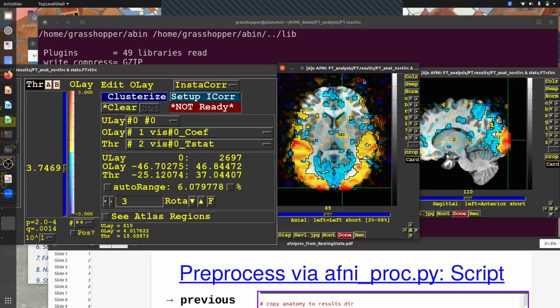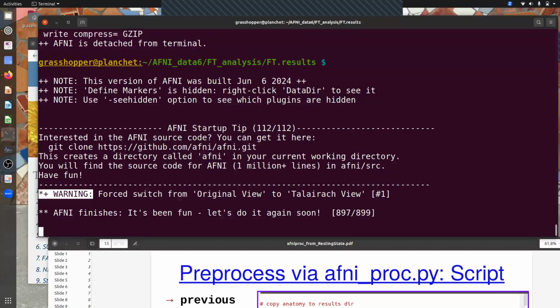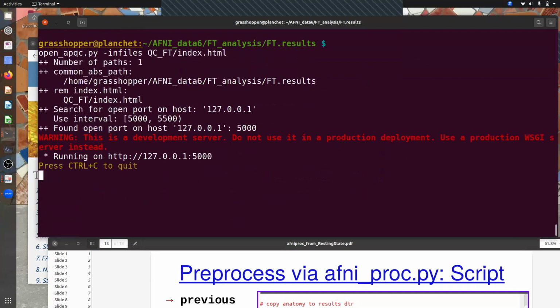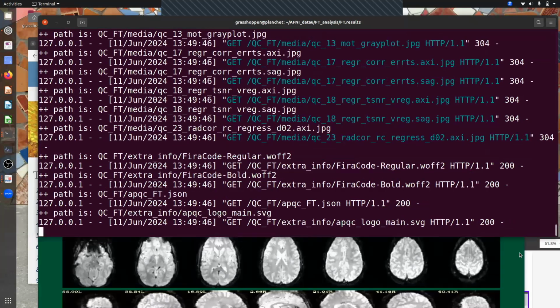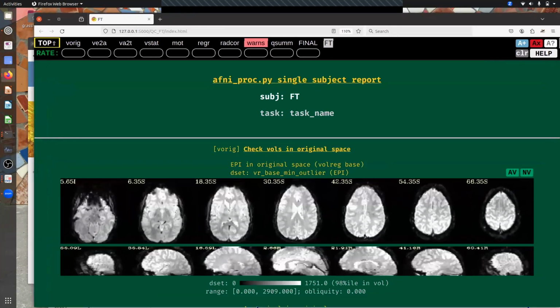Now, to get to here, we've jumped from my raw data, we look at the time series, and we said that, you know, that flow chart of things. So there are lots of intermediate steps to look at, to deal with checking those intermediate steps. We could go through the files and look at things. But another thing that AFNI creates is an HTML report of lots of different features of the data. So everything matters with your data from start to finish to get those statistics there.